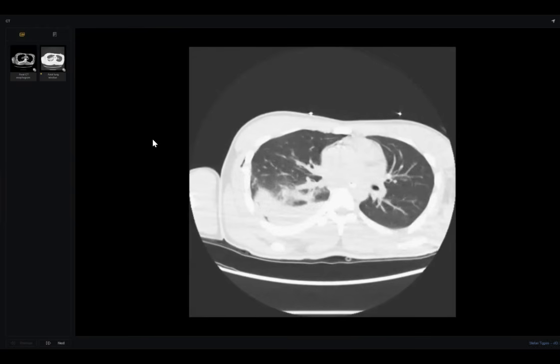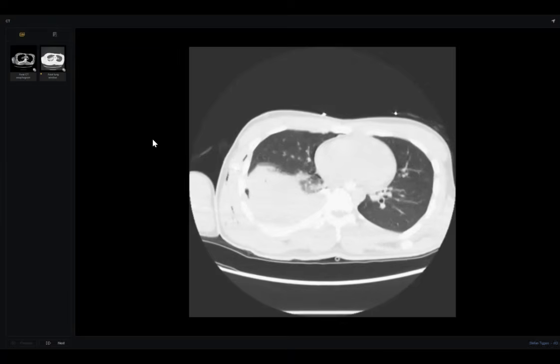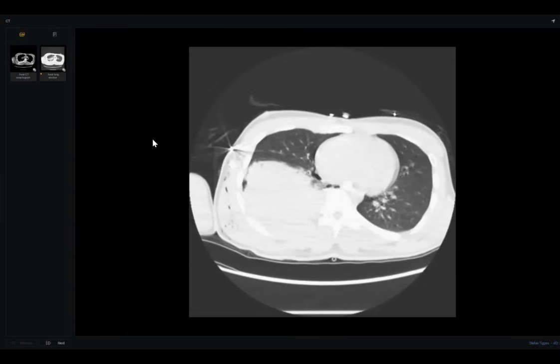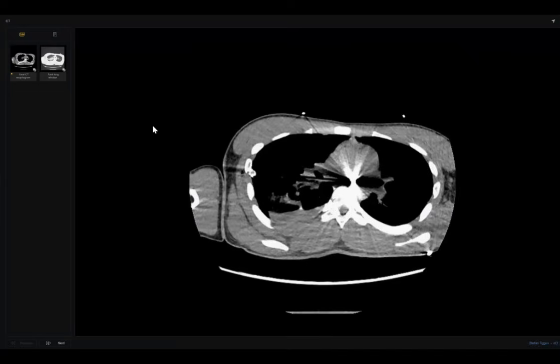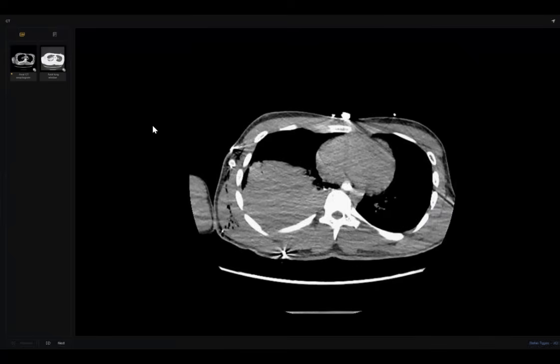See, before I forget, advice for you: when you are shifting from chest X-ray to CT and you are finding the same findings without a big change, just say one phrase: the CT confirms the previously mentioned X-ray findings. Then search for another big disaster. When the examiner follows you and gives you the CT, it means there is something new.